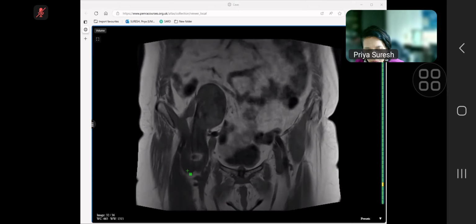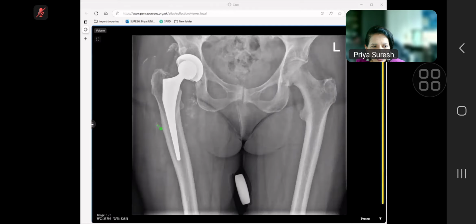So remember, for everybody who's looking, if there is a prosthesis and there is calcification there, or lucency in the bone, and the lucency can be really big, it can be a big pseudotumor. What I have seen is it can either be completely intraosseous, or there will be a lot of trochanteric bursitis and soft tissue mass.